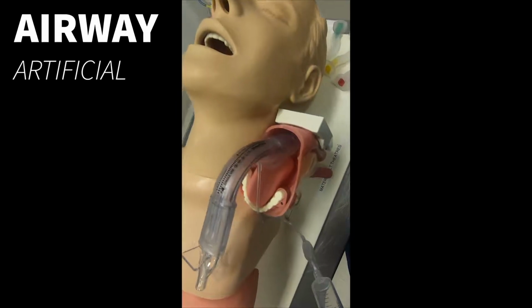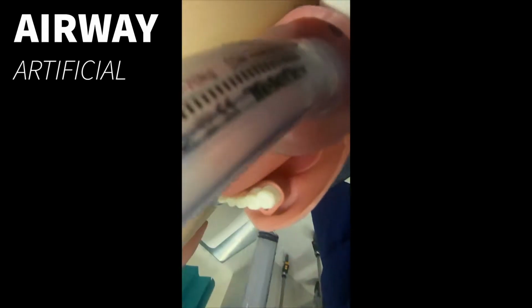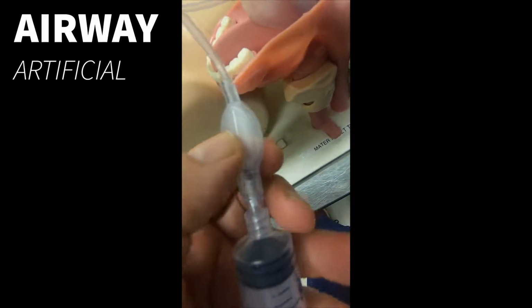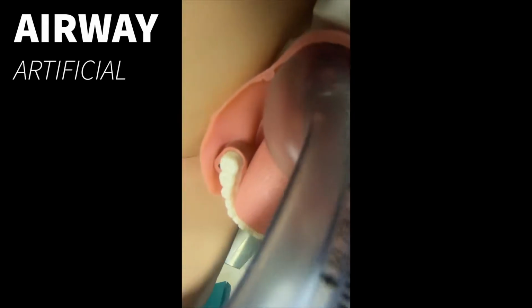Inflate. It doesn't need a whole huge bit of air, so I'll just put 20 mils in. You can see that pumps it up really quite nicely. And on my pilot here, that's still quite empty, but you have a good filled cushion there.